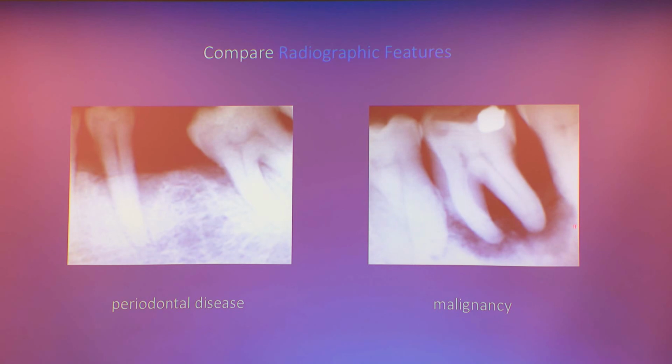It's very, very fuzzy, certainly no cortication. And beyond it, there's no evidence of normal trabecular bone. So there's a very wide transition zone that suggests that whatever this is, it's invading the bone. Also, if we extrapolate, it looks like the bone levels are about normal over here. We can't see it, but there's bone here. I can tell because of the pattern.